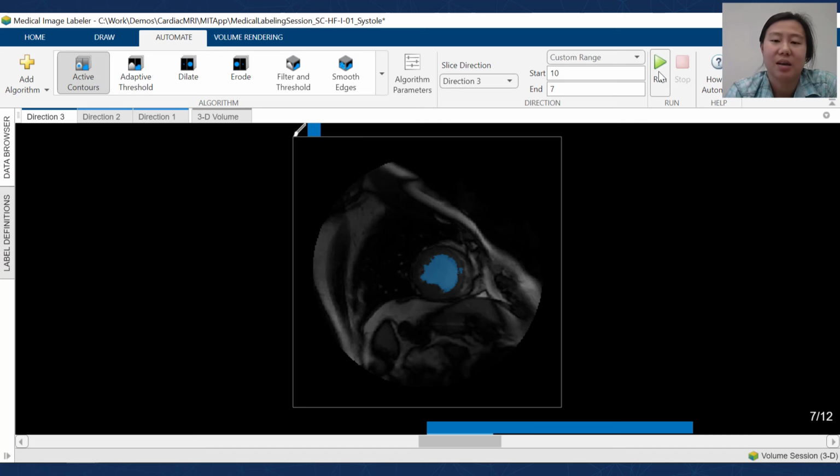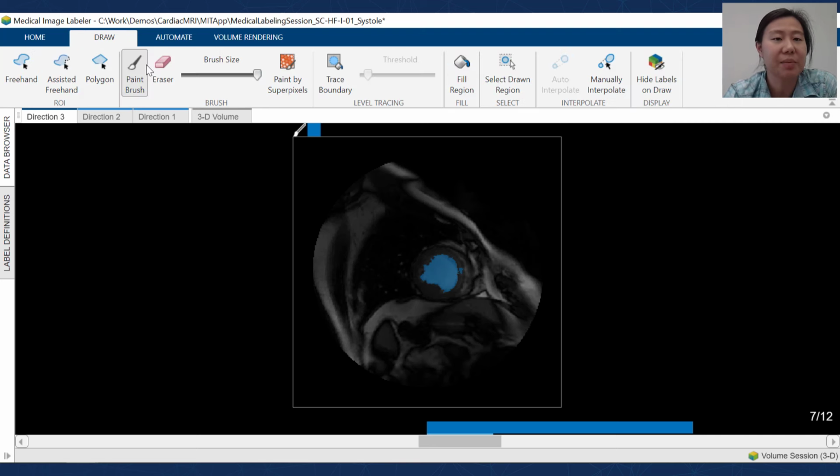And you get a similar result here of attempting to get some of that volume information based off of just 2 segmented slices, right? And then again, I can come back here, maybe this little extra bit off to the side is not necessary, it's not correct, and I'll go ahead and clean that up, right?